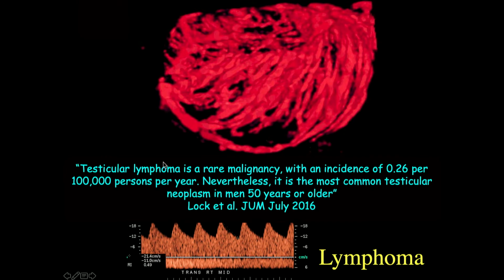But look at this, testicular lymphoma is a rare malignancy, but it's the most common testicular neoplasm in guys over the age of 50.